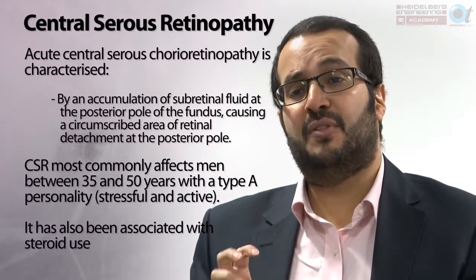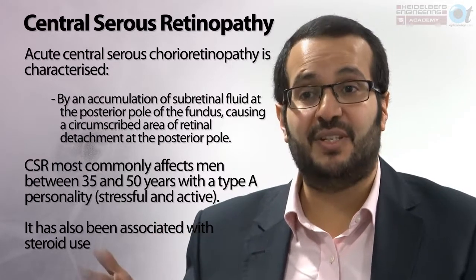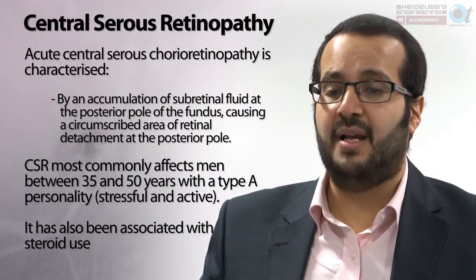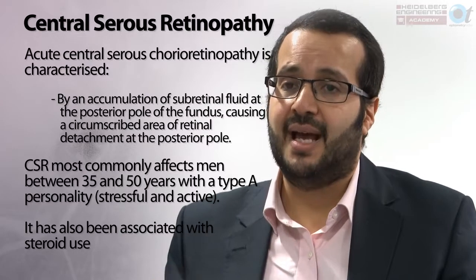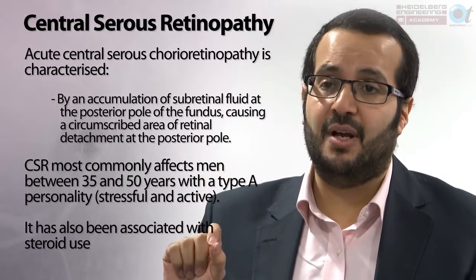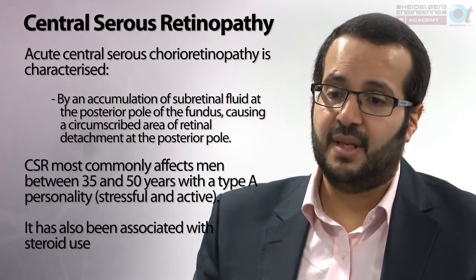Now let's shift the focus to something we see commonly in practice, which is central serous retinopathy. That's characterized by the accumulation of subretinal fluid at the posterior pole of the fundus, causing a very circumscribed area of a neurosensory retinal detachment at the posterior pole.